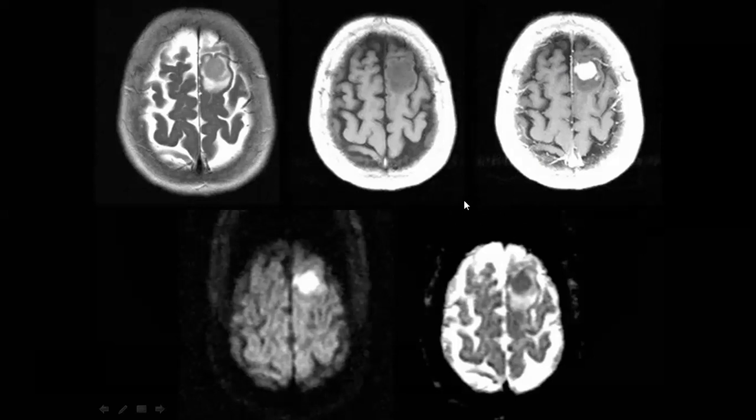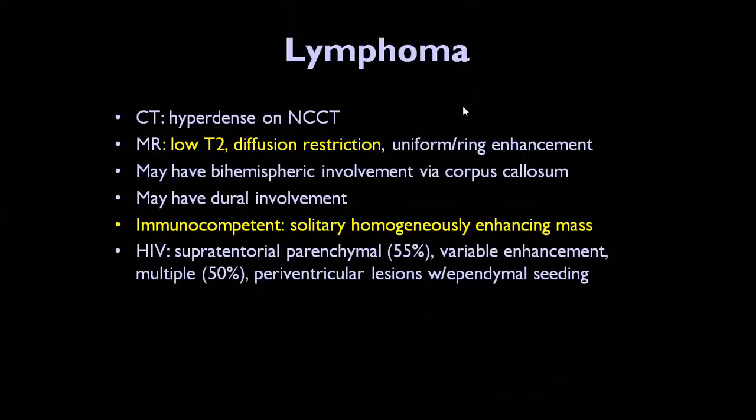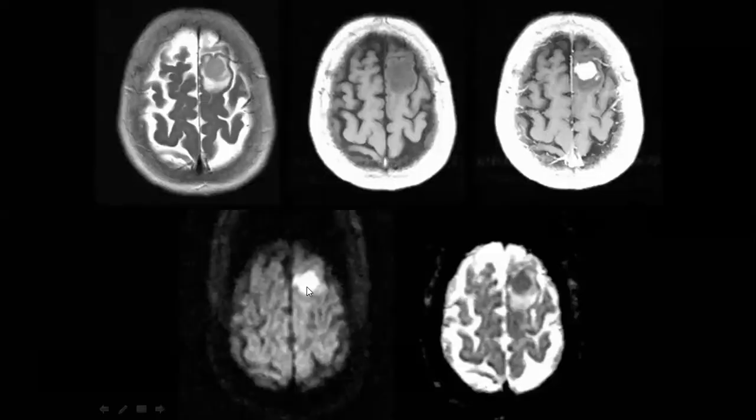So why did you mention that it is melanoma? When you find something in the T2 that is very low, and it takes intense enhancement, go for a differential. One of the good differentials that you put can be melanoma, but melanoma in the T1 should be high. Here it is low. So lymphoma, metastasis, and lymphoma it will be, because of the restriction of diffusion. So this is the diffusion weighted image, and this is the ADC.